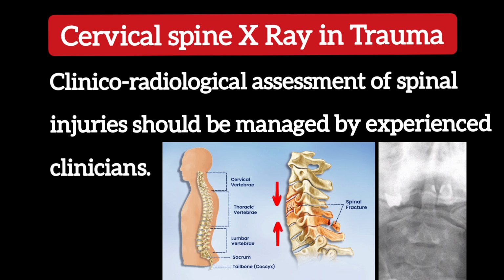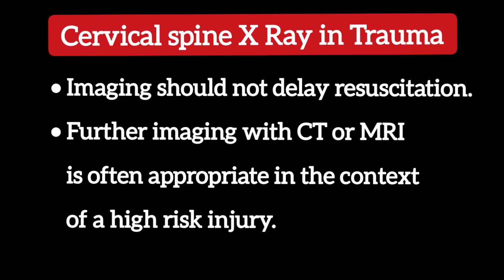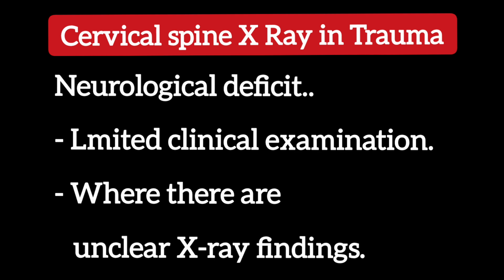Clinico-radiological assessment of spinal injuries should be managed by experienced clinicians in accordance with local and national clinical guidelines. Imaging should not delay resuscitation. Further imaging with CT or MRI, not discussed in this video, is often appropriate in the context of a high-risk injury, neurological deficit, limited clinical examination, or where there are unclear X-ray findings.